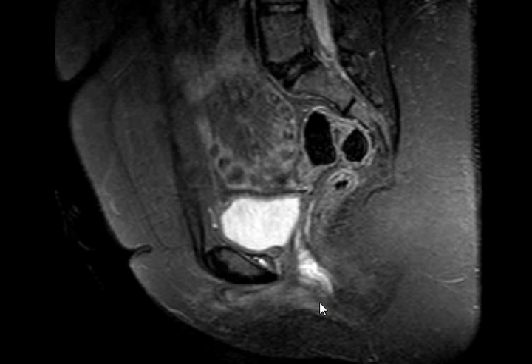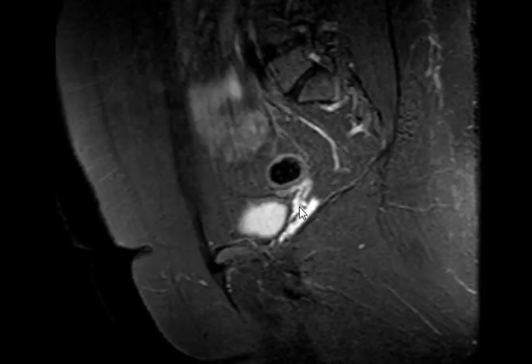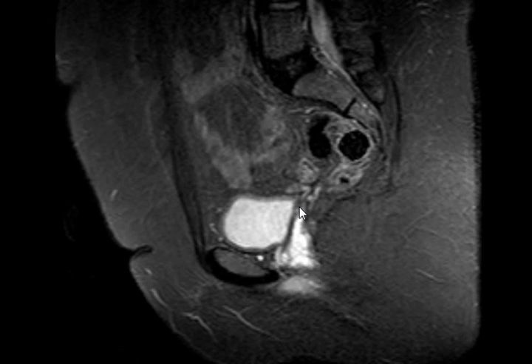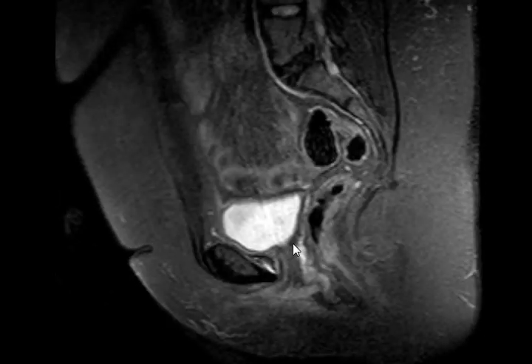You can't find the uterus. Yes. What about the ovaries? In T2, we see the follicles, which have a high signal intensity. Do you see them here? So your diagnosis? There is absence of uterus and ovaries. Complete absence or agenesis of the uterus and ovaries.